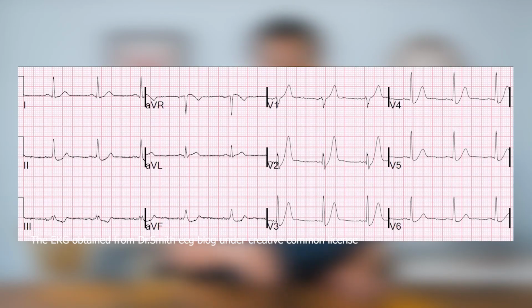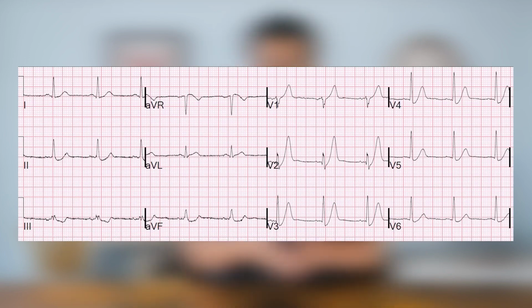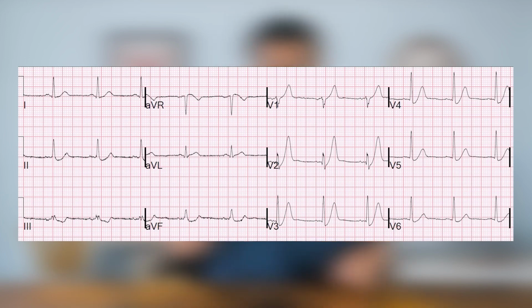How about this EKG from a 30-something-year-old patient with chest pain? Of course, I'm immediately drawn to those hyperacute T-waves in anterior leads, but notice that these hyperacute T-waves are preceded by ST depression with an upsloping ST segment. This is an important distinction from the posterior MI pattern, where there is ST depression in the anterior leads but not the distinctive upsloping ST segment of these fat and bulky hyperacute T waves.